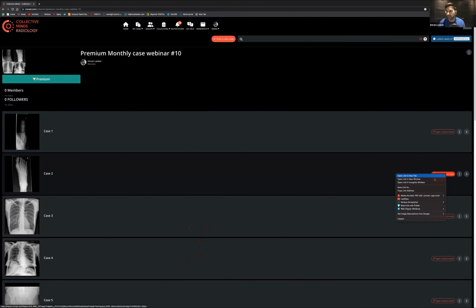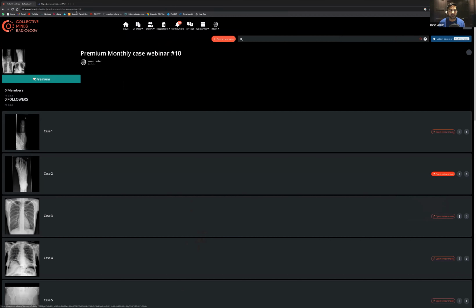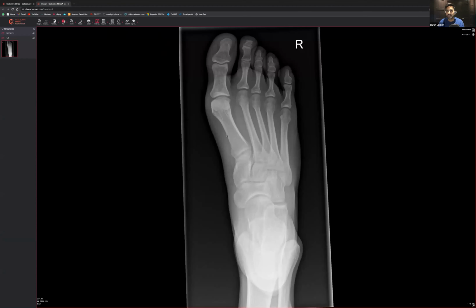So let's open up a new tab and have a look here. By the way, sometimes I've uploaded these cases from quite a while ago, so I have been known to forget what it is. So if you do think that you see something that I haven't seen, just let me know. Just put it in there. Right, so let's have a look and see.